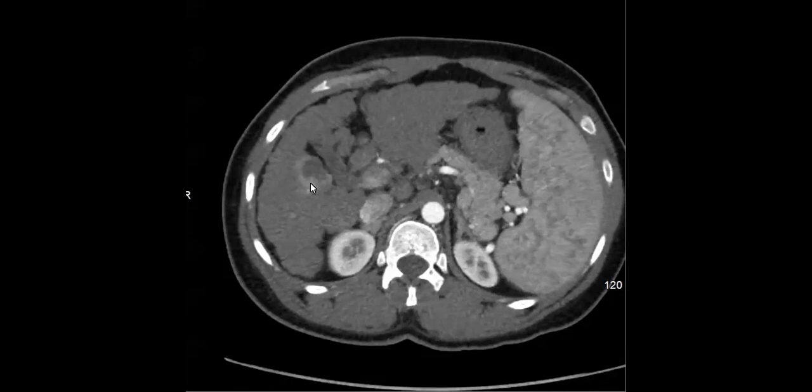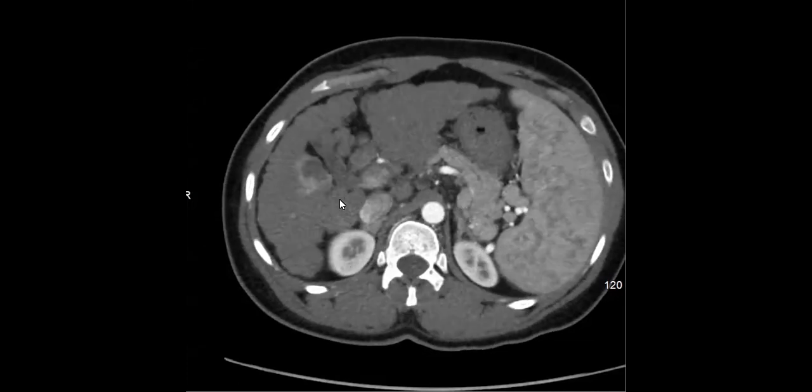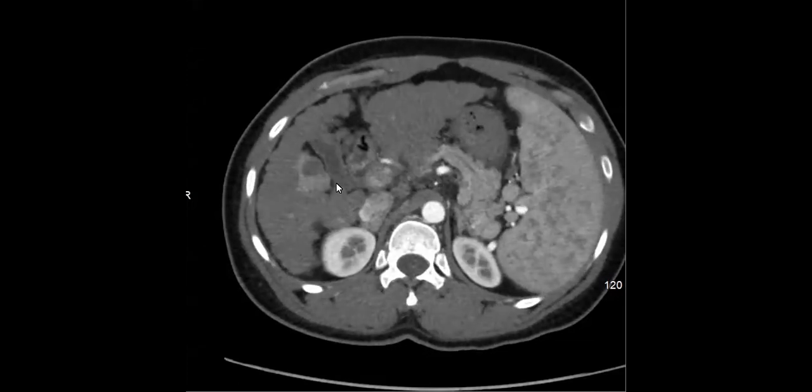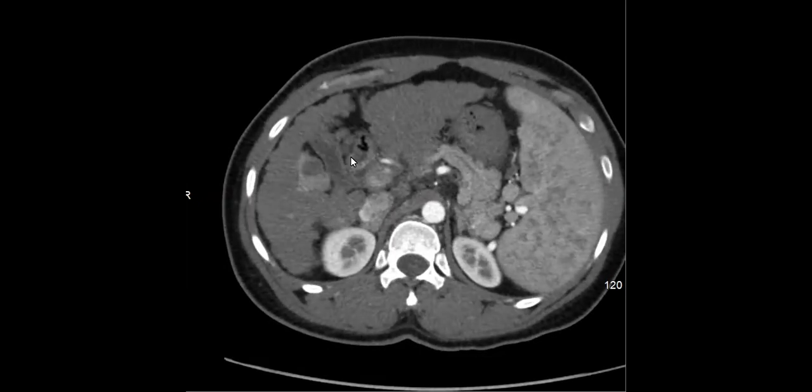It's rim. Okay, right? So I was thinking that the bottom rim looks too big. So if that rim washes out, this is fantastic because the rule is, if you're not sure, you go with rim. It's a great illustration, right? If you're not sure whether this is rim or non-rim, you go with rim because you want to preserve the specificity of LI-RADS 5 for HCC.